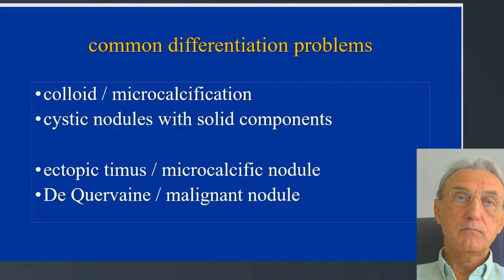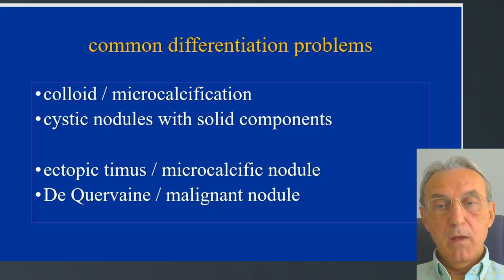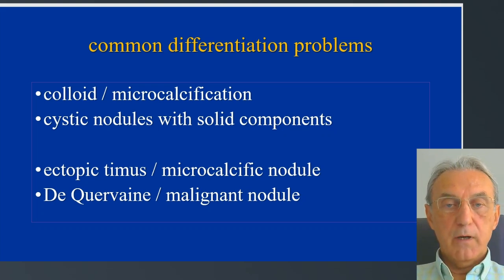So, to summarize, we have some common differentiation problems, and these are still unsolved. We cannot always differentiate colloid from microcalcification.